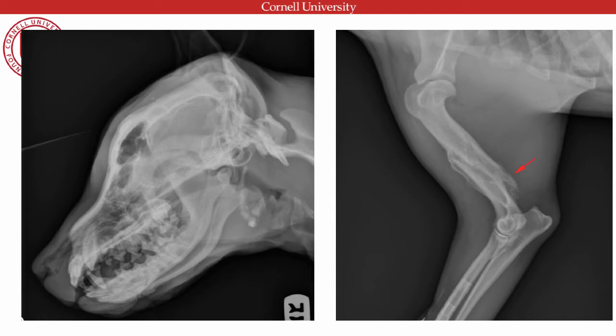What about this skull? Yeah. We've got a little fragment here, haven't we? I thought that the top of the calvarium was a little ill-defined and looked a little sclerotic, and like there was some sort of smooth new bone formation happening. And so for me, that looked like a periostitis, secondary to probably chronic, previous microfractures on the head.